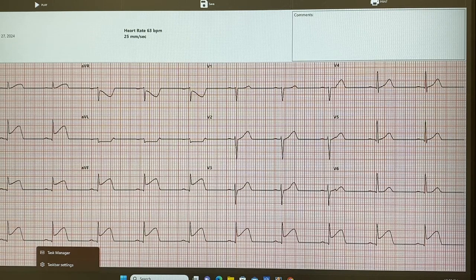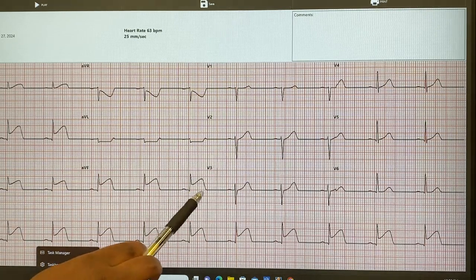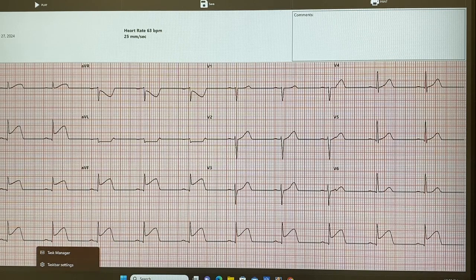So where do you see the problem again? Which precordial lead? V3. So which side of the heart is the problem at? Right side, the right ventricle. So the patient is having an MI in the right ventricle, maybe more inferior, because it's in V3. We don't see it in V2 or V1. Does that make sense? At the base of the septum, but on the right side. That's advanced, but it's good to know. When you're looking at a 12-lead EKG and you see this is a STEMI, let me take a peek and see if I can figure out where the STEMI is. Camera angles. Exactly.